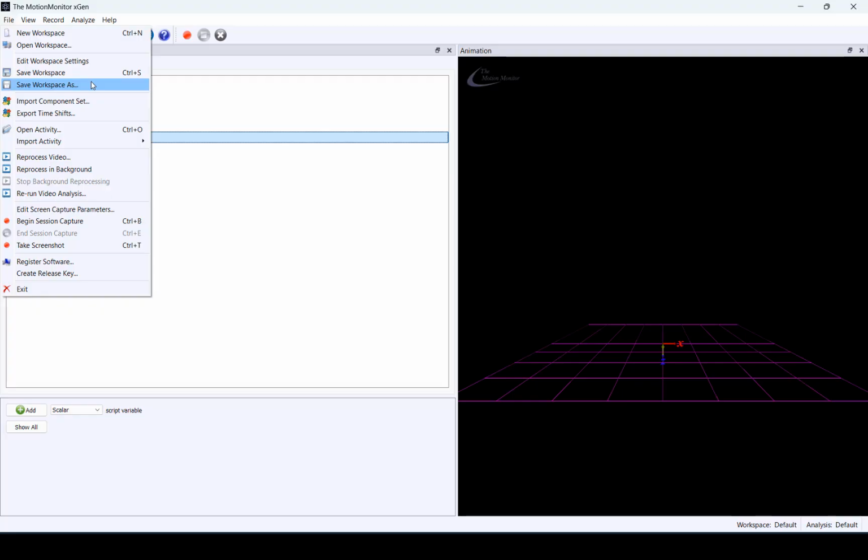It is best practice to load and save a named workspace for data collection or for batch processing, especially if there are multiple projects within a single user. This prevents inconsistencies, and if saved in a deactivated state, will set the icons appropriately and should make for a smoother, repeatable, and more consistent data collection or analysis process.